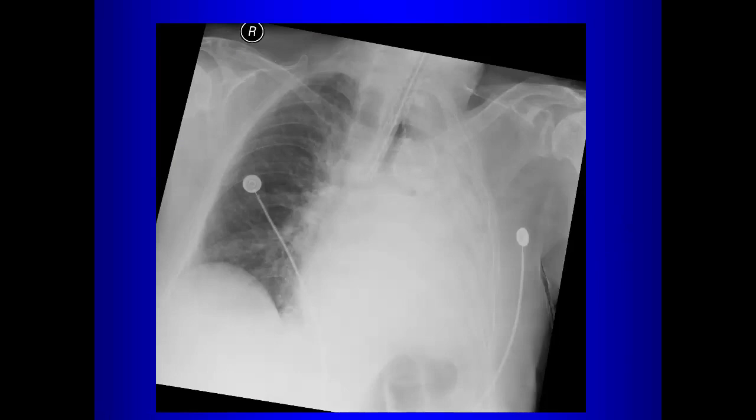Well, first of all, is this pleural effusion or atelectasis? Pleural effusion. You see the right heart border? He says no. So what is this, atelectasis or pleural effusion? Atelectasis. This is complete atelectasis of the lung. So why does this patient have complete left lung atelectasis?